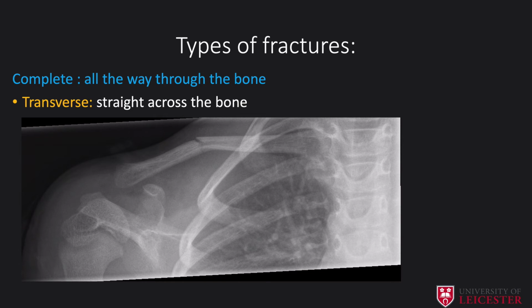The transverse fracture is a type of complete fracture where the fracture is straight across the bone. Here you can see a right clavicular transverse fracture.